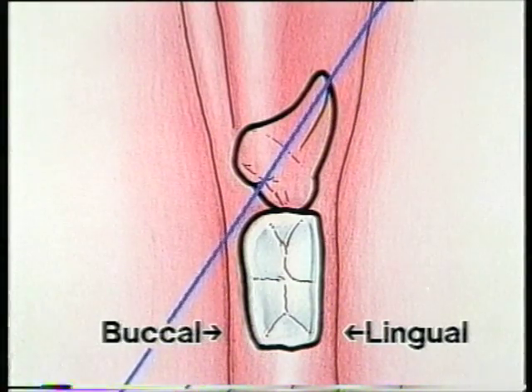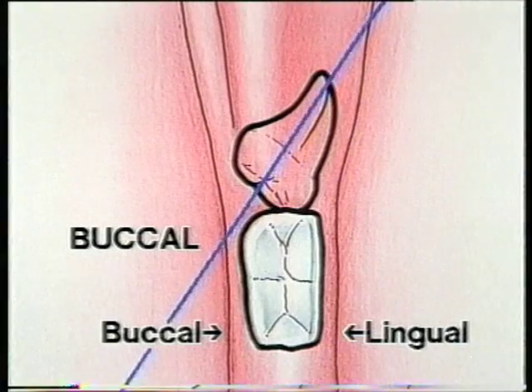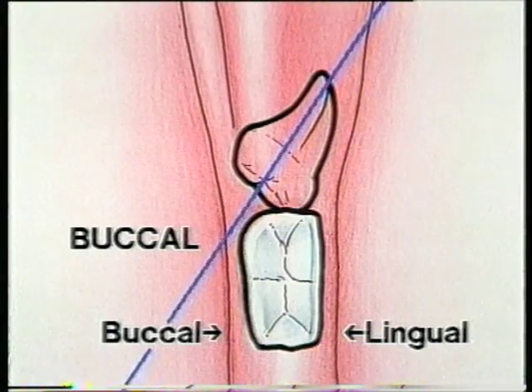In the second type, or buccal version, the long axis of the third molar points buccally. On this periapical film, the appearance is that of the occlusal surface of the third molar turned away from the viewer. That is, farthest from the intraoral film. In both buccal and lingual versions, the tooth may also be seen sagittally to be vertically, horizontally, mesioangularly, or distoangularly impacted. This is just to make it more difficult.